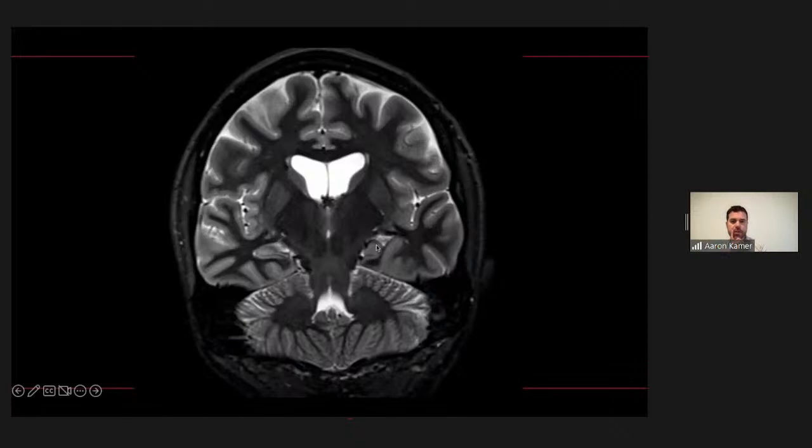I totally agree. It looks almost like balled up. It doesn't look like it's laying flat like the normal hippocampus. And the collateral sulcus is much more vertically oriented. Have you seen this before or know what this is? If not, I wouldn't be surprised at all, not because it's you, obviously, but because it's not something that many of our residents have come across.